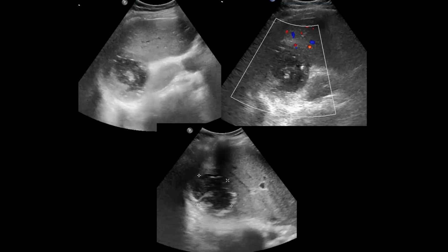Sometimes abscess can be diagnosed by ultrasound. If you see a liver lesion containing gas, that's usually very diagnostic of an abscess. This is an ultrasound of the liver of a patient. You can see there's this necrotic mass in the right hepatic lobe, and you can see these echogenic foci. These echogenic foci sometimes can be interpreted as tiny foci of gas or areas of calcification. But with experience, you tend to be able to differentiate between gas and calcification. They have slight differences in their appearance. So this was very suggestive of an abscess.